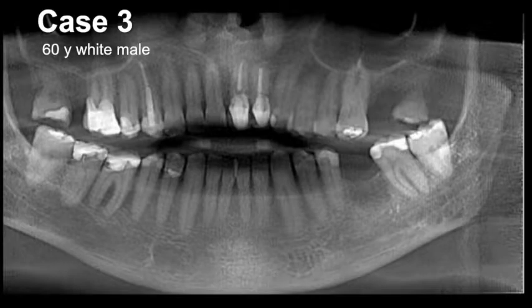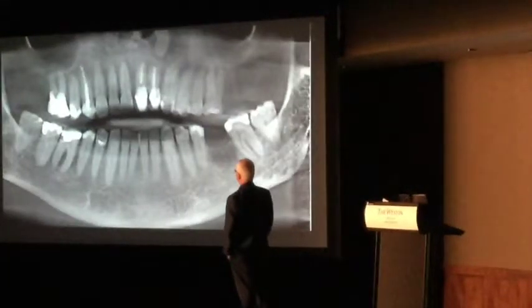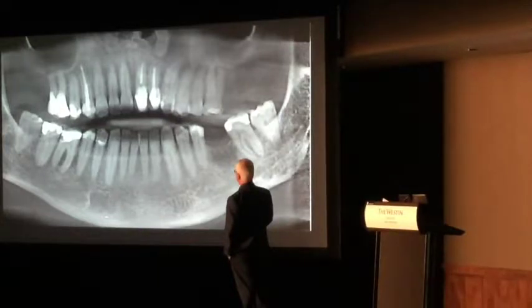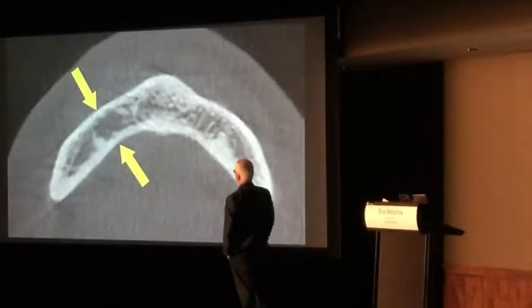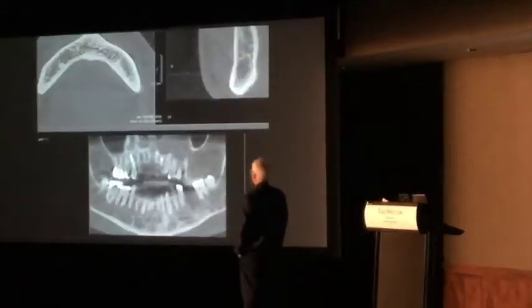Somebody might look up in here. There has been some root canal procedure, so maybe there's something going on. I looked at this and went, that looks odd. So I did a thinner slice, and you can see it stands out a little bit more. This looks about the same. This looks different, and this is the same area as the other side. There's the mental foramen, of course, and the inferior alveolar nerve is probably this portion, but I can't tell you what's going on in there.